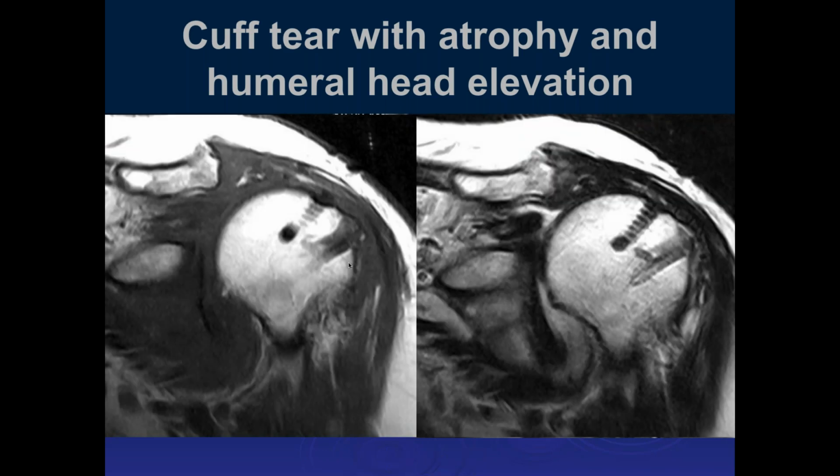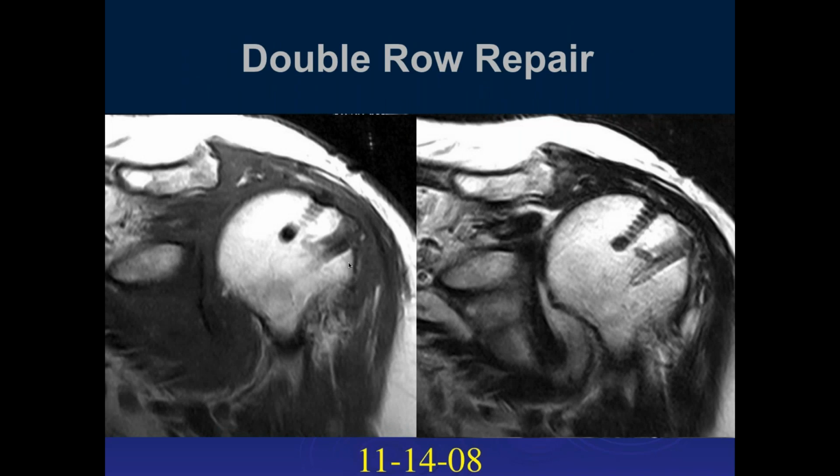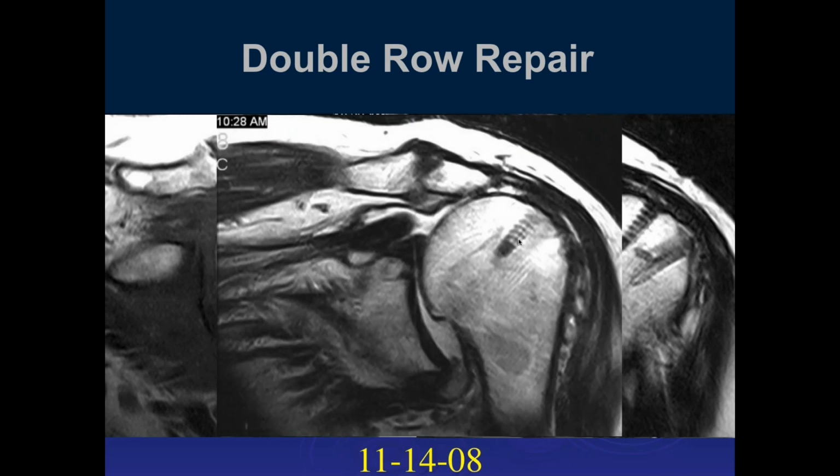They then put in suture anchor repair. This is a double row technique, which we can see here, and it tore again. So this patient was a very poor candidate, and as would suggest from the data, with all these findings, the chance of a successful repair over time is low. So this was a retear of the suture anchor construct with proximal retraction.